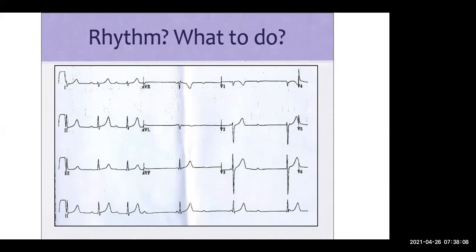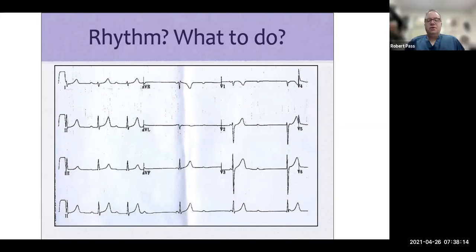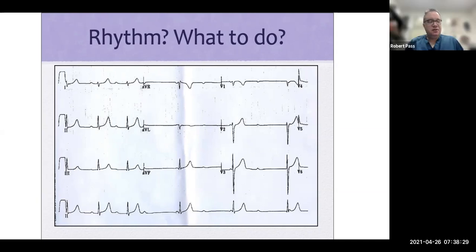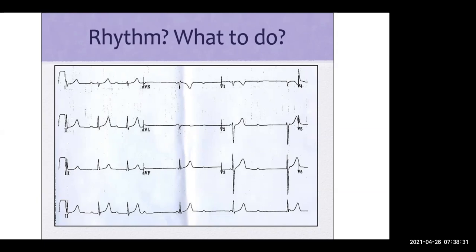The only thing is it's probably third degree block, I think, rather than a second degree. So in third degree heart block, what happens to the RR interval usually? It should be the same. All right. Is this a fixed RR interval, or is it variable? No, it's not. It's variable.